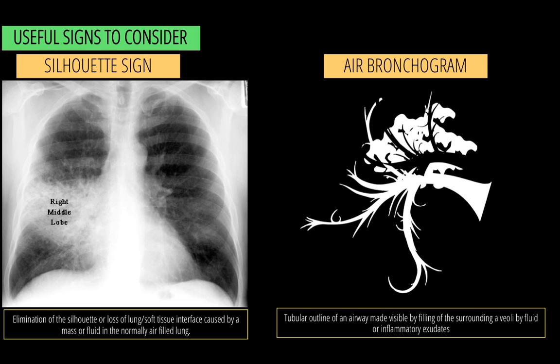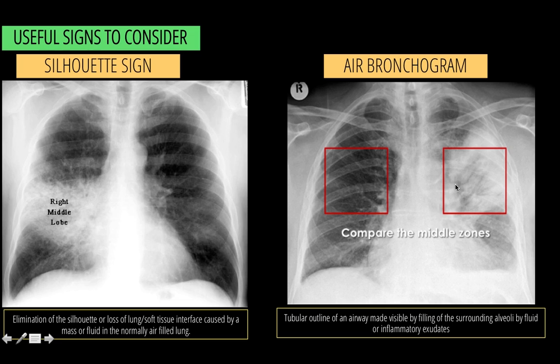So if we're looking at areas of consolidation, you should see an increased opacity associated with the lung tissue, and you should also see a decrease in the airway or alveolar opacity, which is going to be radiolucent, which is going to then be a key sign of consolidation. So the x-ray above shows us the nice clear tracings of these air bronchograms within that consolidated space.